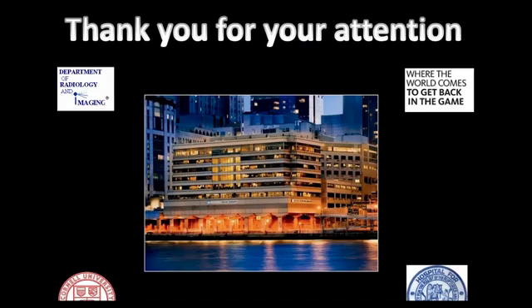It's sometimes synonymous with the lateral recess, but really not. The lateral recess is when you don't see the facet joint. But if you think of the lateral recess, think of the subarticular zone as the part of the lateral recess where you see the facet joint on the images, is one good way to operationalize it, I think.